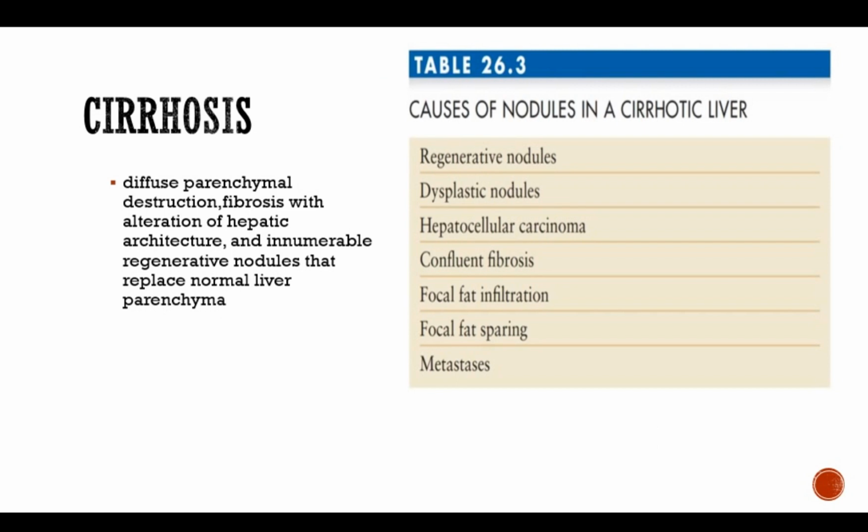Now cirrhosis. Cirrhosis is destruction of the liver parenchyma, which is replaced by fibrosis and innumerable nodules. So in cirrhosis, we will have nodules, and these are some of the causes of nodules in a cirrhotic liver.